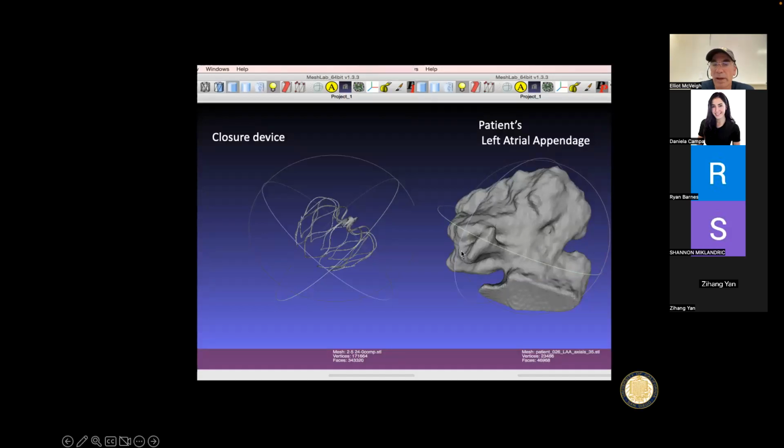You can measure a left atrial appendage with great detail to obtain its geometry. And perhaps, as has been in some of the literature, people say, just given the geometry, we can give you relative risk of thrombus happening here. I'm not sure I believe that. But you can get a really detailed picture of the geometry, including the orifice through which blood goes into the left atrial appendage from the left atrium.